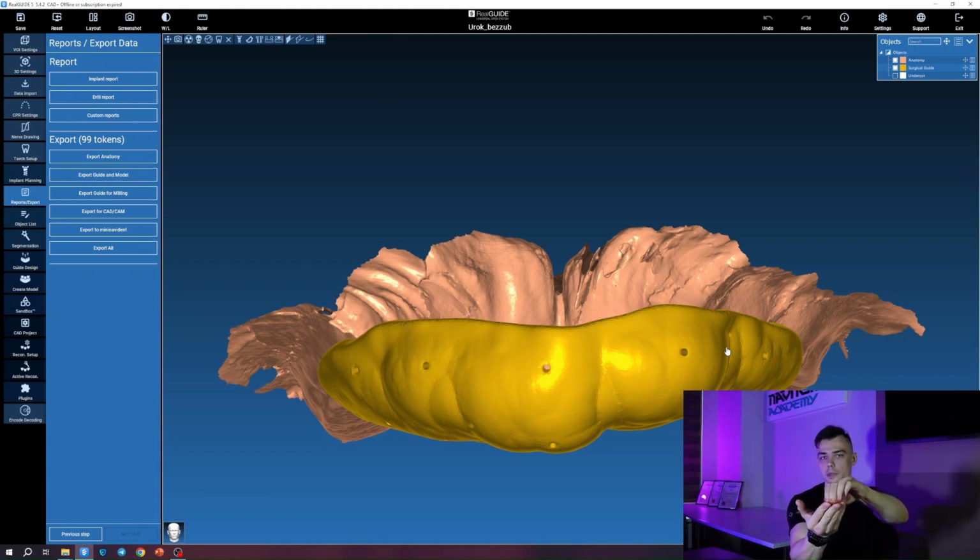It doesn't move around. It fits snugly, meaning it doesn't move at all. Of course, if you press really hard or try to shift it forcefully, there will be some slight play, but you need to keep in mind that during the surgery, you also fit the future surgical template to the edentulous mucosa and secure it with pins, which will definitely hold it firmly in place.